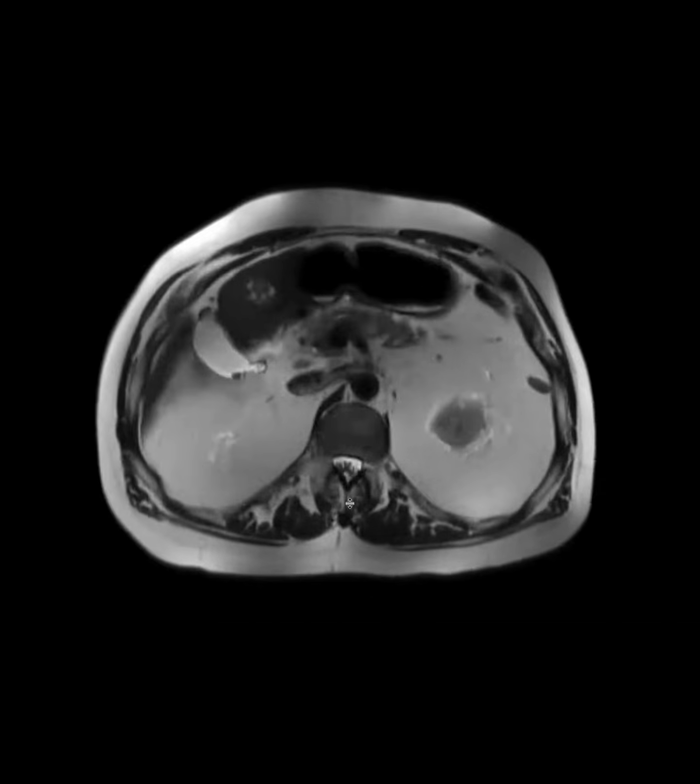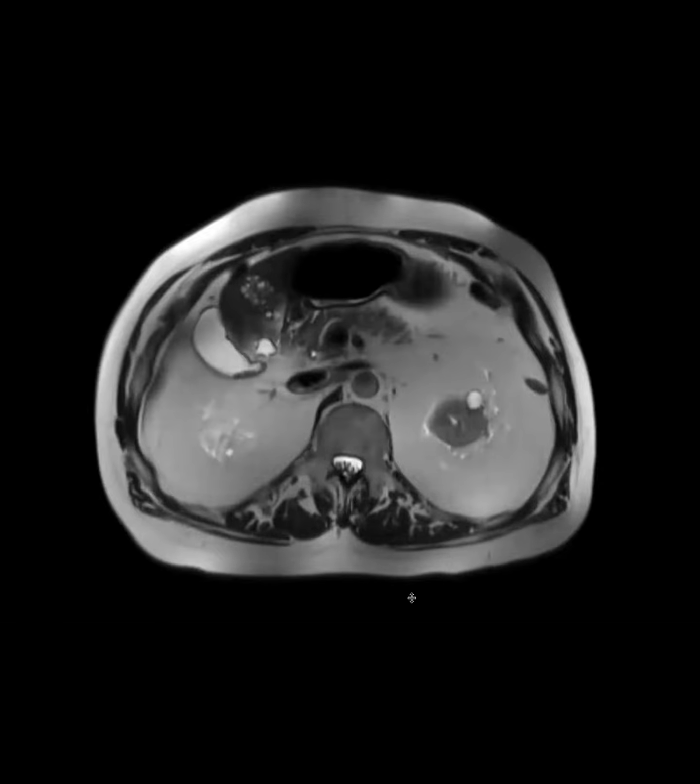And no central obstructing lesion. And it's been around for a few years. So here's one from a year prior. Does it connect to anything outside the liver? It feels almost like it extends outside, like these little things here. Where is that inferior one connecting to?